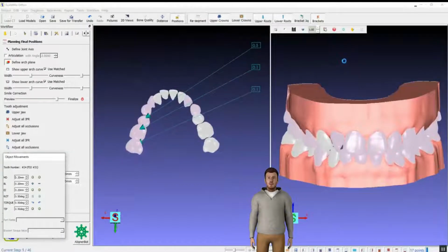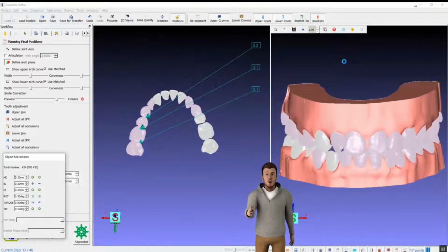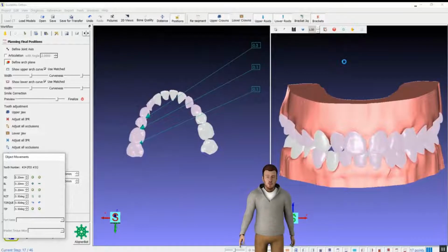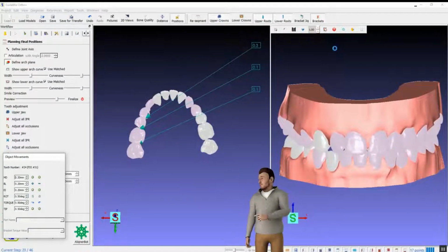If the handle is dragged, the tooth will be rotated around the center. If you simply pick the tooth, the rotation is done around the geometry center of the tooth. This is for placement only. Later, use the right click to access the context menu.